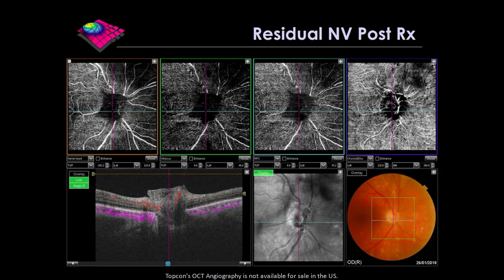And so here's her angiodisc, her OCTA, and you can see that the neovascular tissue is gone, pretty much. And you can see that it doesn't have the perfusion through it, the red dots there. So this could be a much better way to assess whether there's activity of this tissue. Now the caveat is you must be very careful because sometimes they might just still have an anti-VEGF on board and it's stopping the flow. And so when that wears off, this comes back.